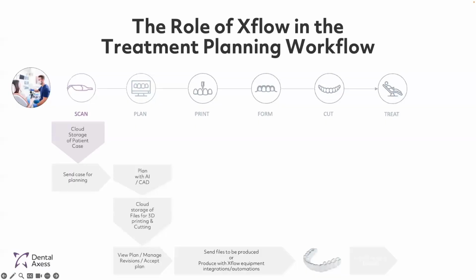Okay, so we have the clear aligner workflow, and if you have worked through this, you would know that it starts with scanning. And here, Xflow connects directly with scanners. Now, it directly integrates, it allows for easy capture of all your patient scan files and photos, and then storage of digital impressions and patient data on the cloud. And this ensures accessibility and security while enabling real-time collaboration with those files.